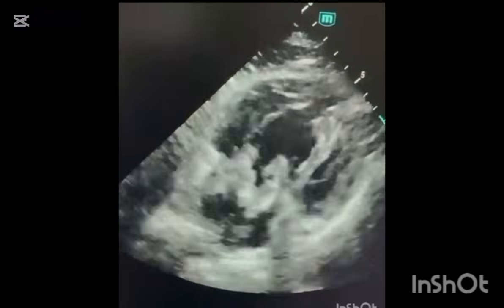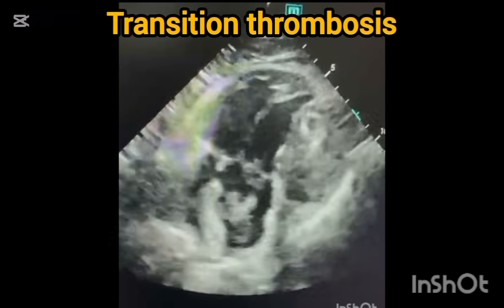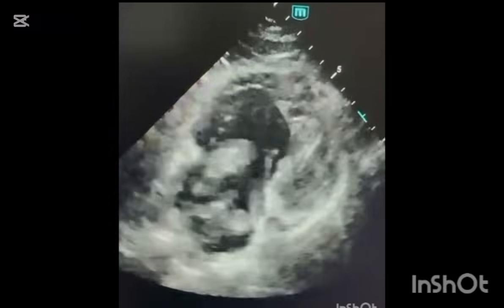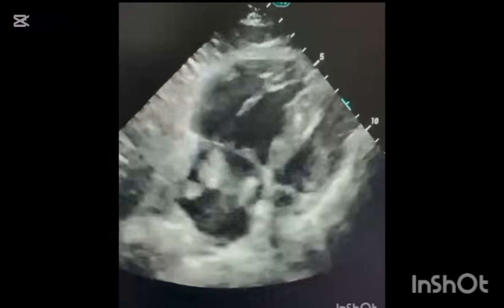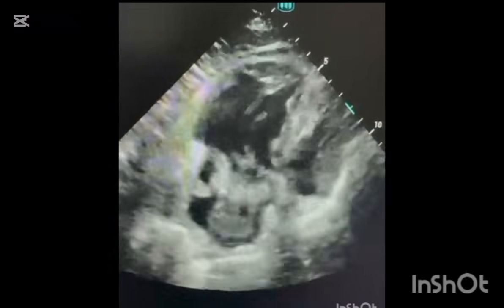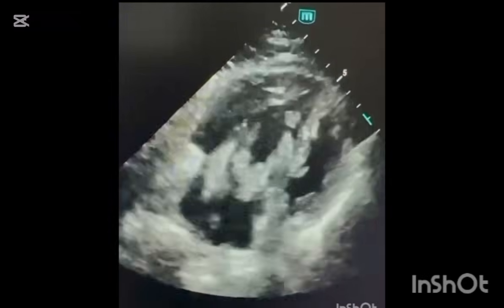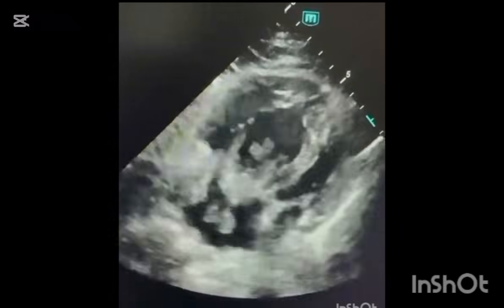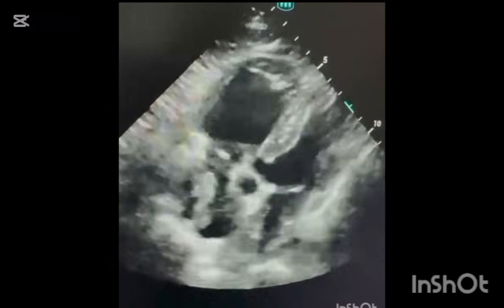In the right atrium, multiple protruding, mobile masses are seen. And look at the RV shape. The free wall is akinetic with apical sparing. This is the McConnell sign, leading to pulmonary embolism.